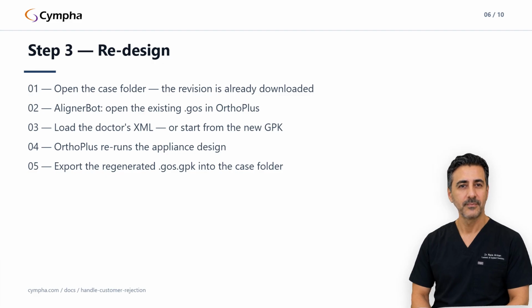Then remember the upload split. Review files and zips go up automatically. Most other types, including the transfer pack, wait for your upload click, and a transfer pack arriving on a changes requested aligner case fires the appliance approval by itself.